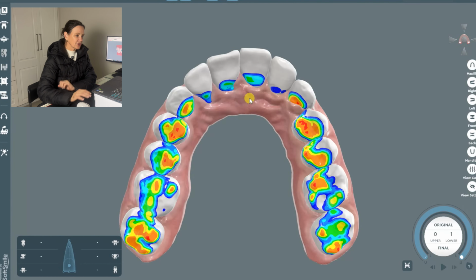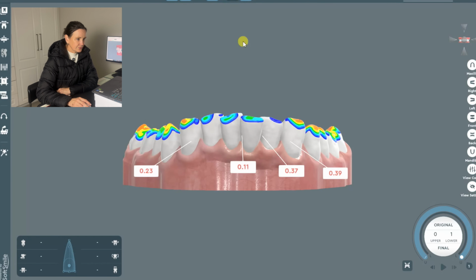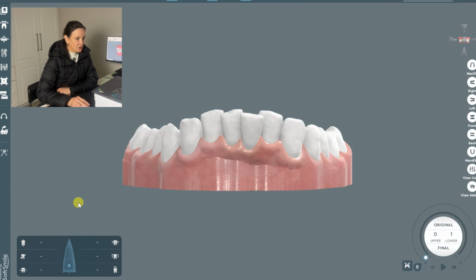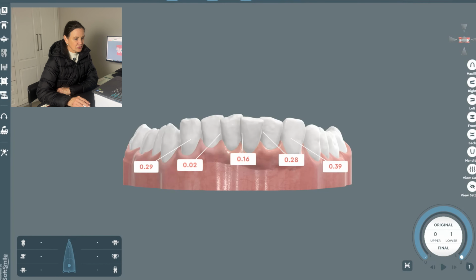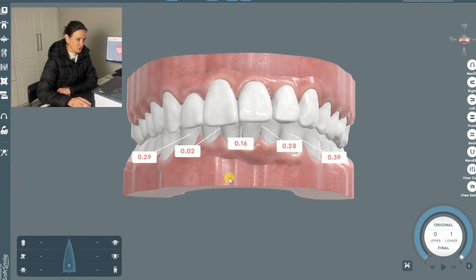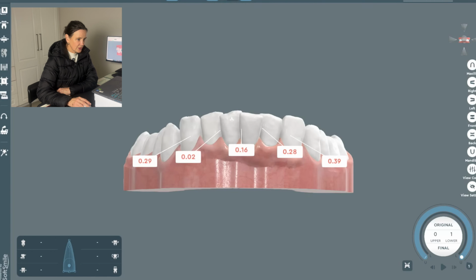So let's go back to the case and to the mandibular incisors. We want to intrude. One always sees this in a class 2. There is no contact, so the mandibular incisors over-erupt till they make contact somewhere. Okay, now I don't want to give her an open bite, so we just have to check how much we're going to intrude for her there.